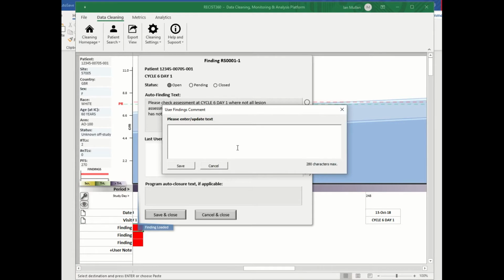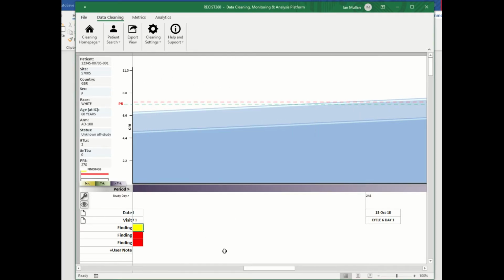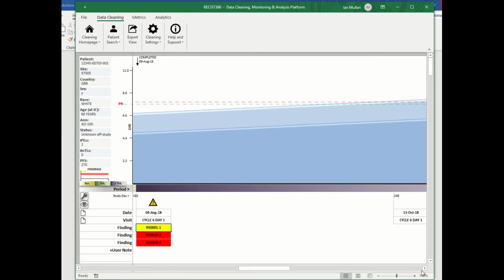The end user can keep track of their actions and change the status of the finding. While some may argue this is duplication, it remains far more efficient, less error prone, and without undue duplication in the long term.